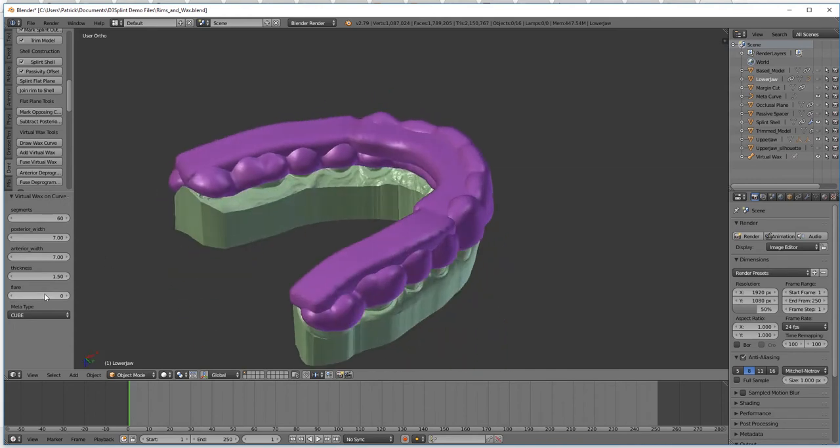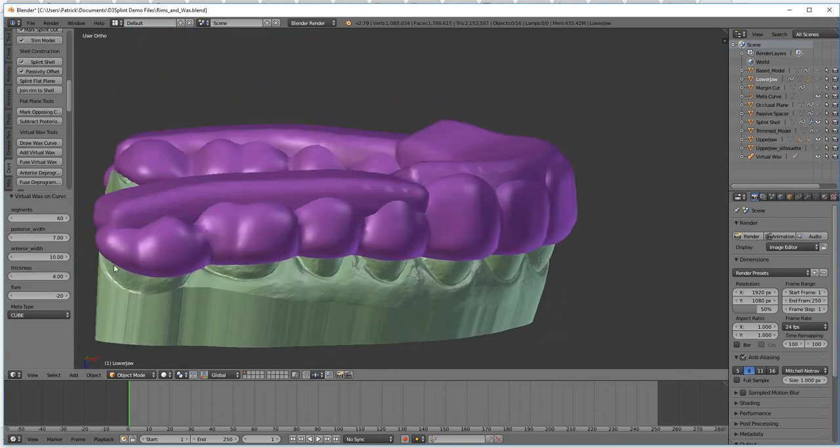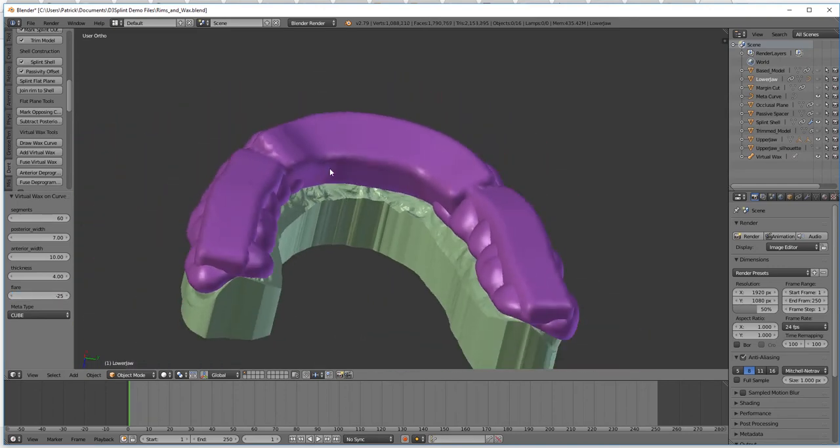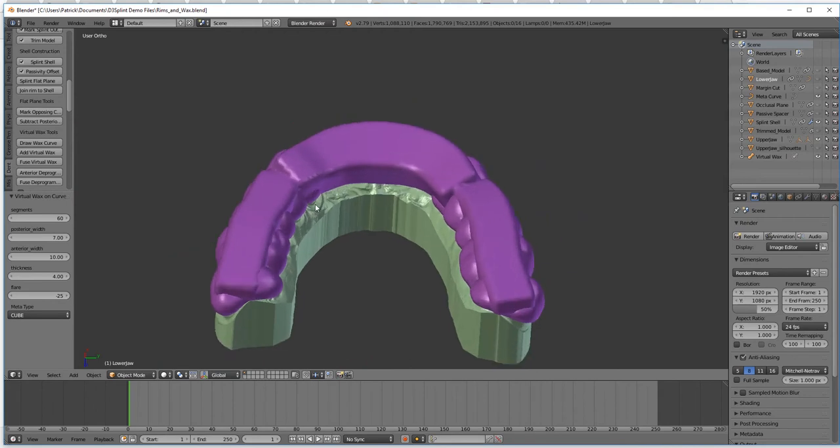we'll use the flare and increase the anterior width and the thickness to start creating the shape of our guidance ramp. Even go a little steeper than that. Now we're set up for a lot easier sculpting and refinement when we go to use our functional surface with the articulator.